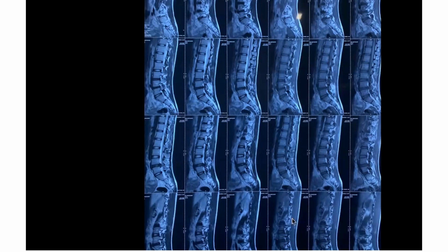So this part is T1 and this part is T2. Many times we'll see them together because we want to compare T1 and T2 to see the different pathologies. This is what we discussed. That's why they gave it in one film, T1 and T2 both. You may have separate films for T1 and T2, but you must always compare both.